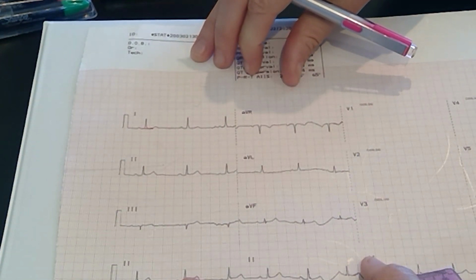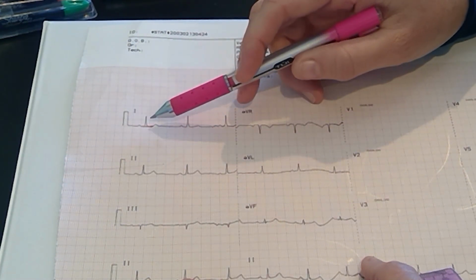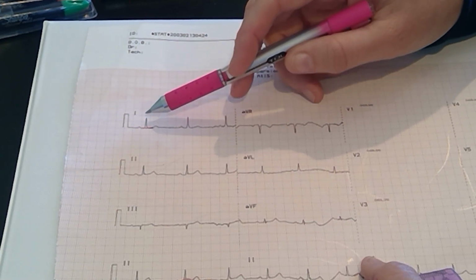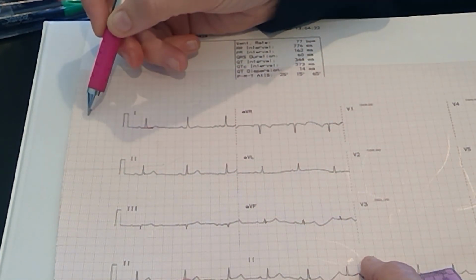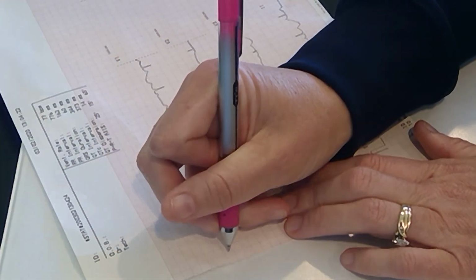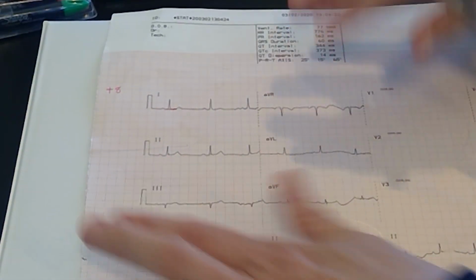It's not rocket science, so make your best fit line. The next thing you do from that line, measure the upward deflection for your R and mark that over here in the column. So this is a +8 for an upward deflection.